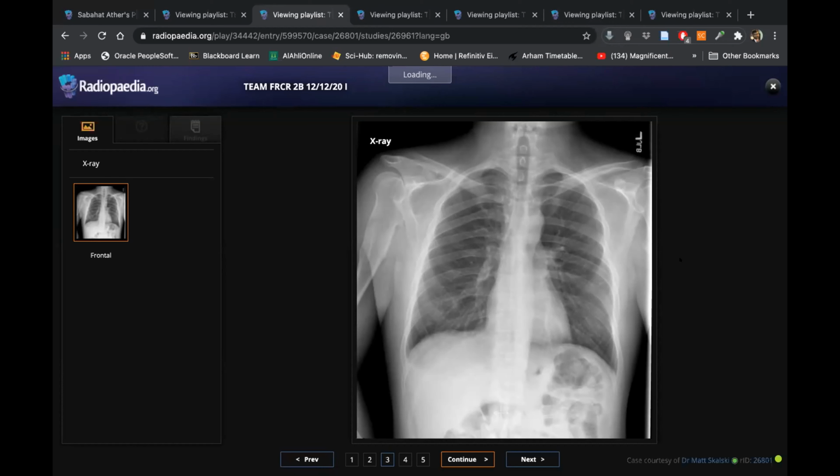Forget about the pelvic pain. What do you think is happening here? There is widening of the metadiaphyseal region of the right humerus, with this rounded one.